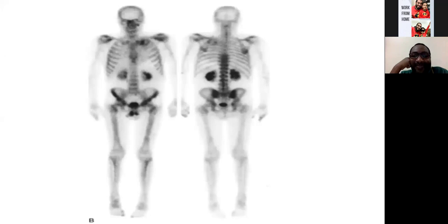I'm presented with a whole body bone scan, anterior and posterior static views, for a patient with squamous cell lung cancer. There is increased uptake in the left upper lobe of the lung, representing the squamous cell carcinoma. There is another focal uptake at the left rib posterior aspect, upper left second or third rib, representing maybe a rib lesion apart from the tumor. The kidneys appear to have high tracer uptake, both kidneys, and the urinary bladder also shows the tracer.